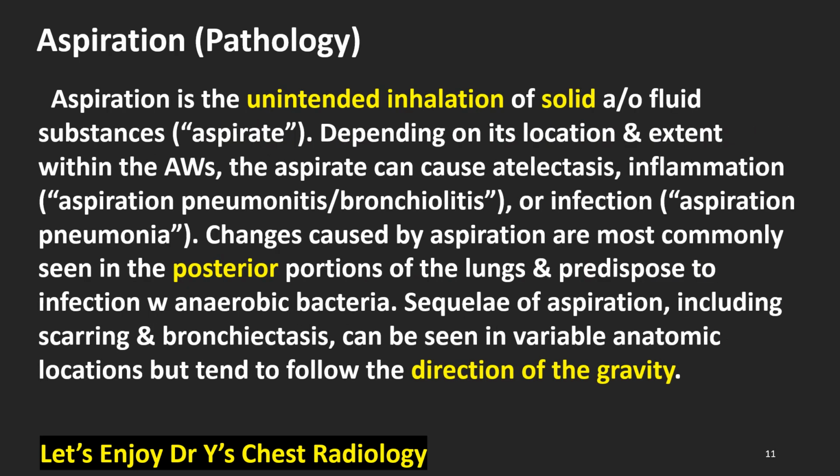Aspiration pathology. Aspiration is the unintended inhalation of solid and/or fluid substances, aspirate. Depending on its location and extent within the airways, the aspirate can cause atelectasis, inflammation, aspiration pneumonitis, bronchiolitis, or infection, aspiration pneumonia.